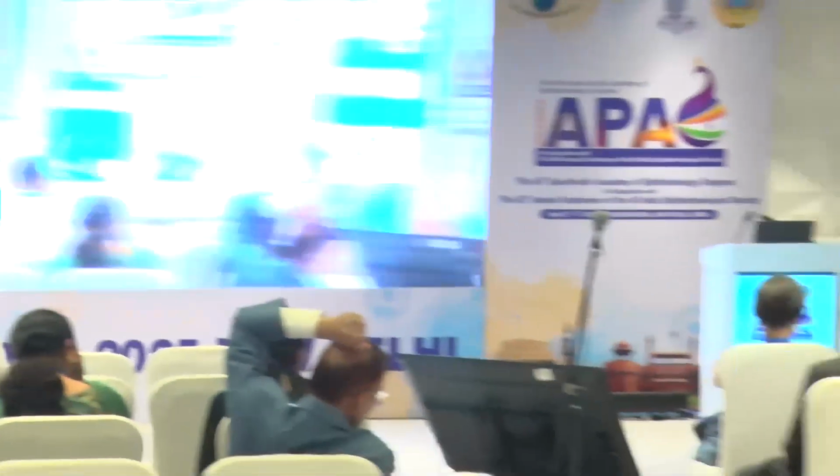Sir, if I may answer the question on the macula. What you were asking about following up the macular program, how do you do it? So there are 16 points. You do the macular program and you follow up every 3 monthly, because it's an advanced glaucoma patient. There are going to be fluctuations, as I have shown you, particularly in advanced glaucoma patients. So the only way to determine whether a decrease is actually real and not a fluctuation is to repeat it.